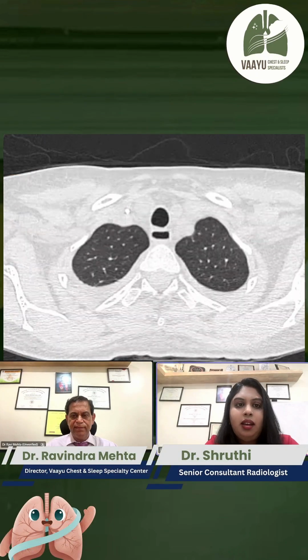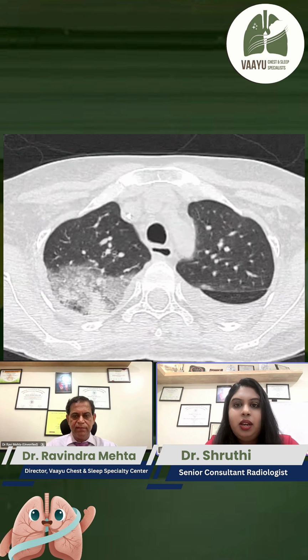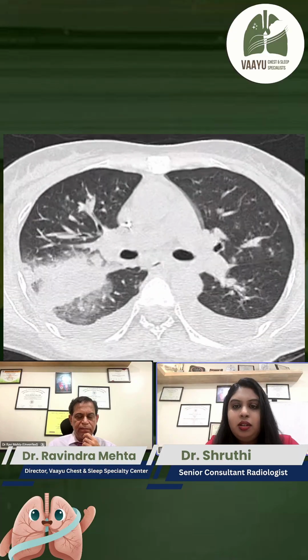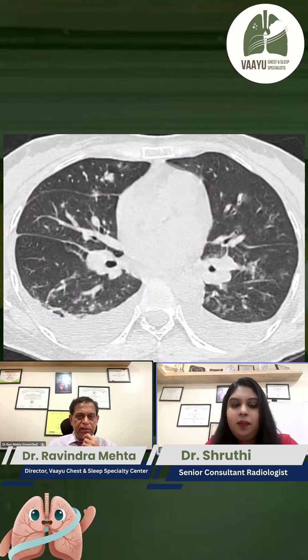This is actually a plain scan. I think angio-invasion requires a contrast CT, where we can appreciate some kind of pseudoaneurysm or vascular occlusion sign, which goes more in favor of angio-invasion. So this was a study which was done as a plain scan.